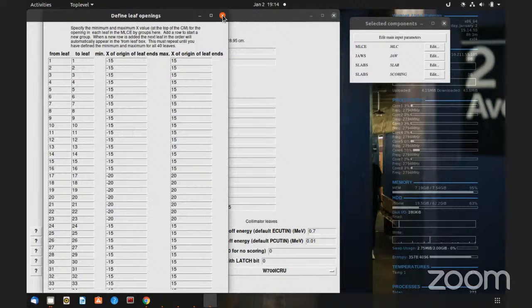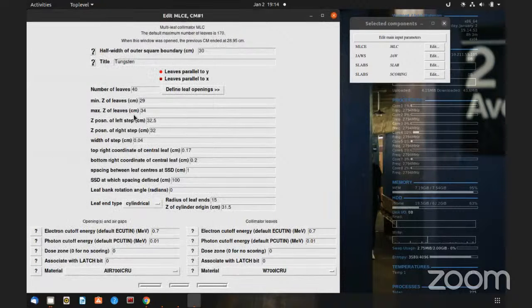You know where the MLCs are. So I would say, for example, the MLC, I will take the middle of the MLC. So it will be a minimum, maximum. In between, this is around 32, right? Yes, sir. 31.5 probably, 31.5.